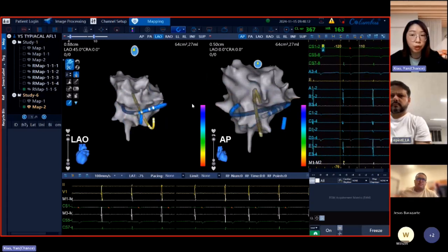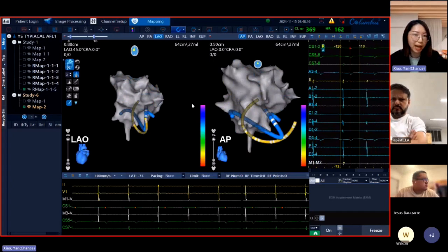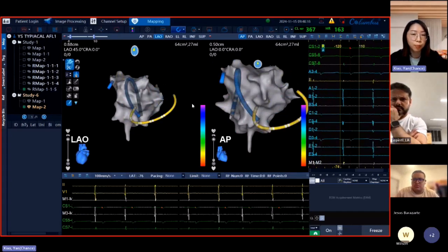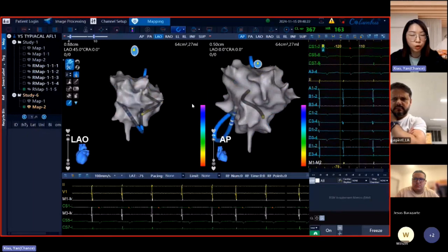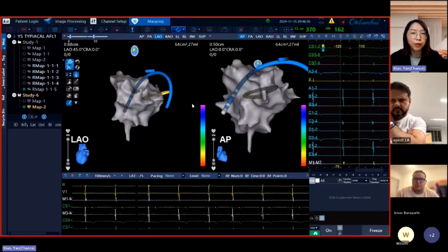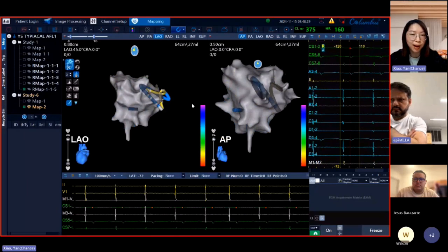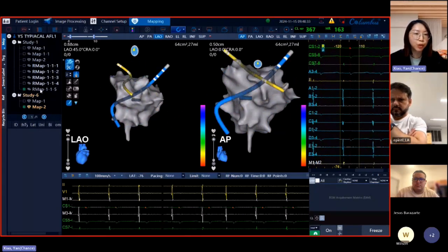If you use the respiration compensation patch, I think all these things will be similar to before. But there's one point we need to pay attention to. For example, in some cases, if you forget to use the respiration compensation patch, what will happen? I will show you.